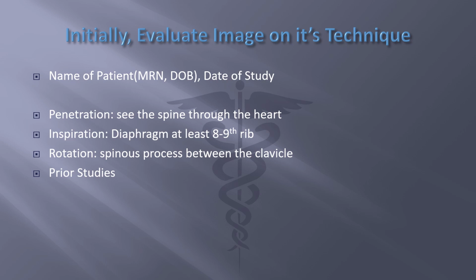When I pulled up their X-ray history, it was the same date but last year. I clicked on the image, and the patient came up intubated, but in this picture the patient wasn't intubated. So I'm like, wait a minute. I looked back, and sure enough, the year was last year. So I almost looked at that X-ray and just assumed it was today. So you definitely look at the dates of the study as well.